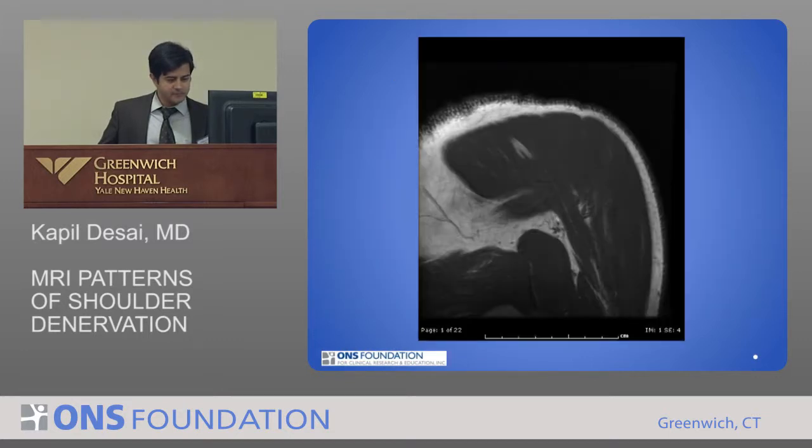If we follow on this coronal animation, we can see the nerve coming down. It comes down from up here. You could follow it right there, kind of in the middle of the fat. You could follow it up, coming down from the neck, down along the chest wall, through that space in the axillary recess, heading posteriorly to the humerus.